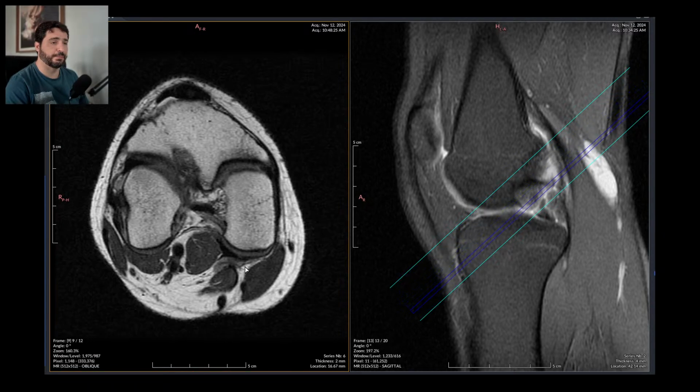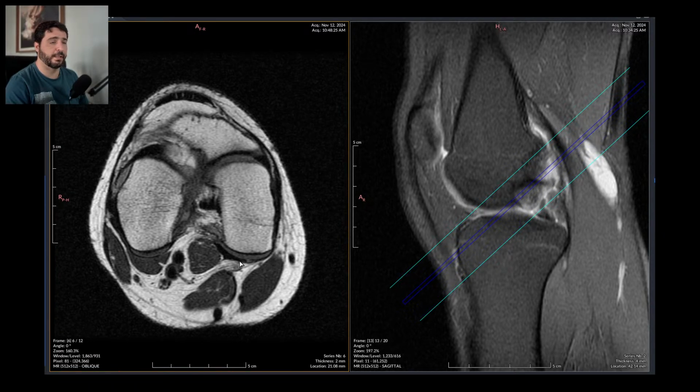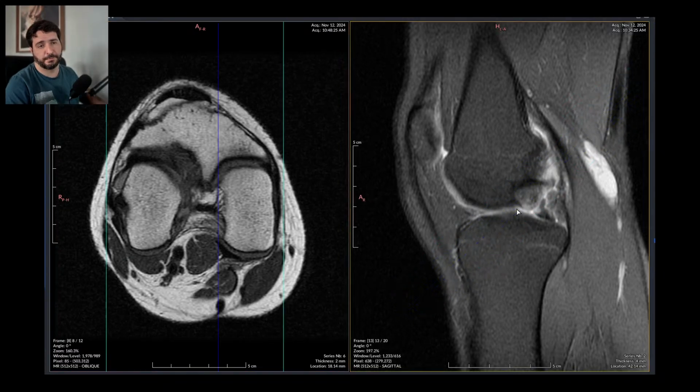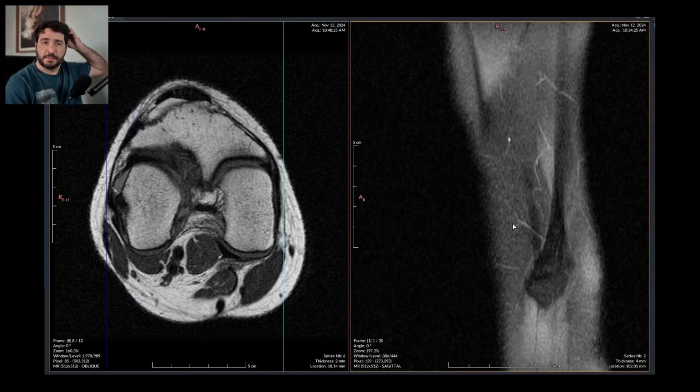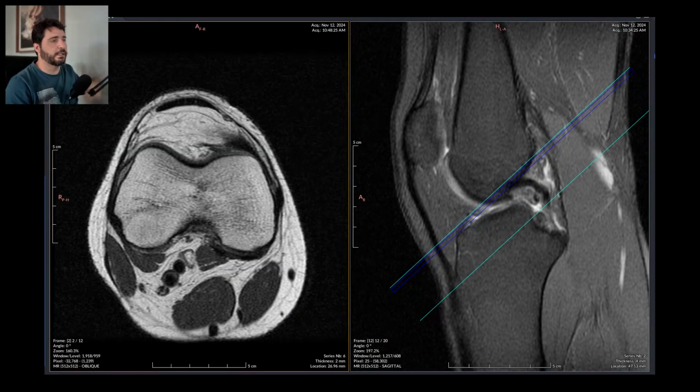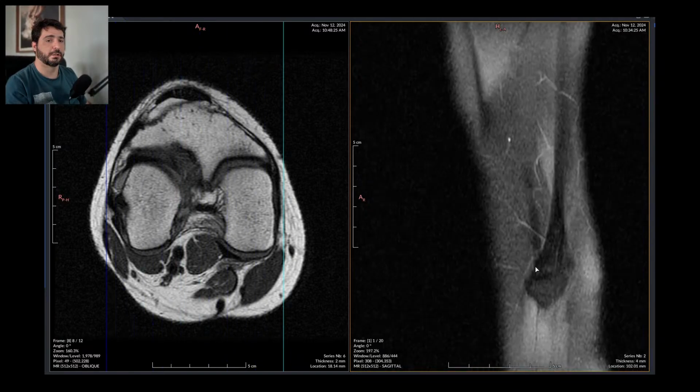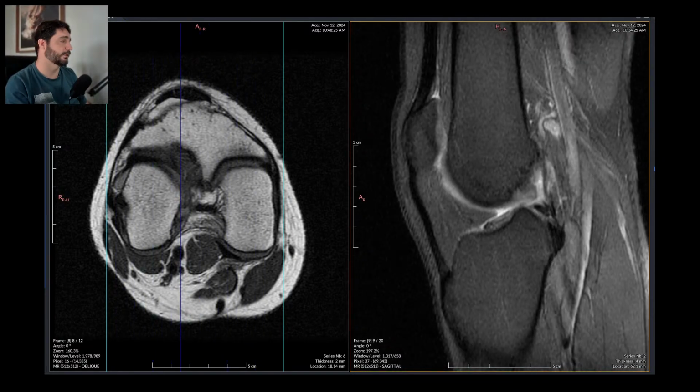So this is ruptured. It's clearly ruptured right there. This isn't properly positioned, but it usually isn't, so we just get used to it. So it's a posterior horn medial meniscus tear and an anterior cruciate ligament tear, a Baker's cyst, and a small articular effusion. No chondral lesions, no hypertrophy, no soft tissue edema. So let's just write it down.